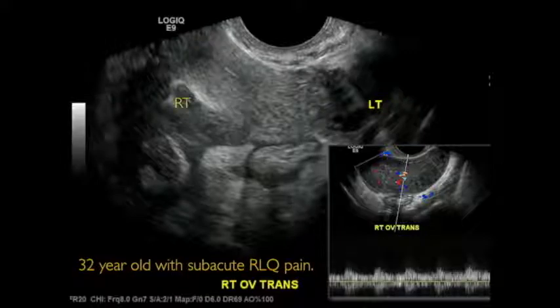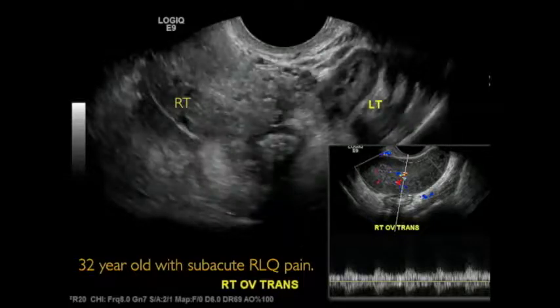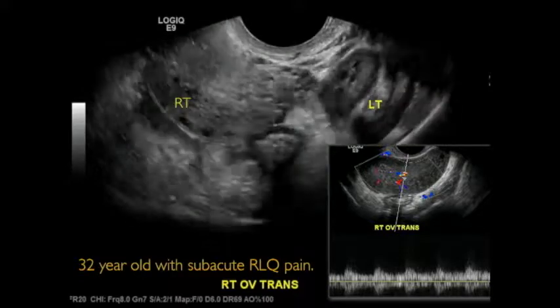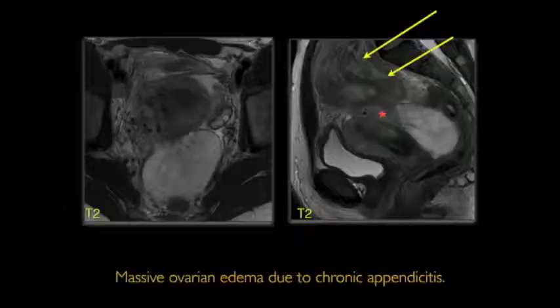A very similar case of massive ovarian edema. This was a 32-year-old with subacute right lower quadrant pain, who had the ultrasound showing a very edematous ovary, but she wasn't really tender at all. And it was so strange. I was kind of like, well, should I get the MRI? Should we not do the MRI? And then we got the MRI, and it was quite surprising to see what we saw.